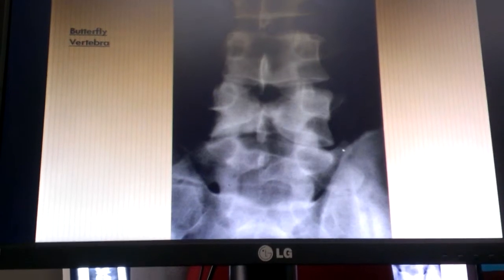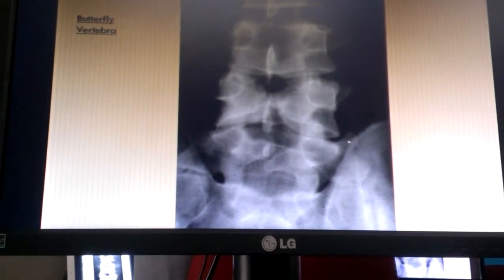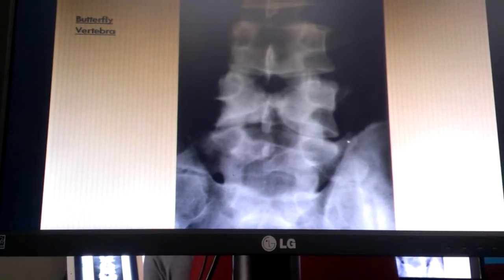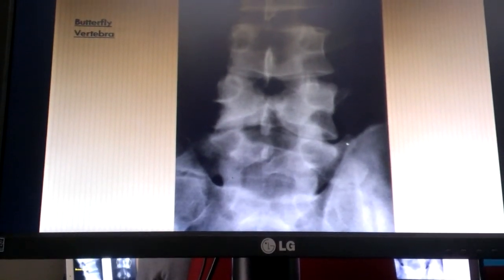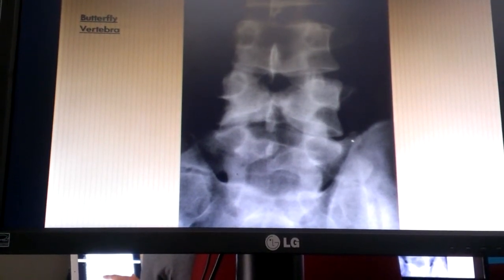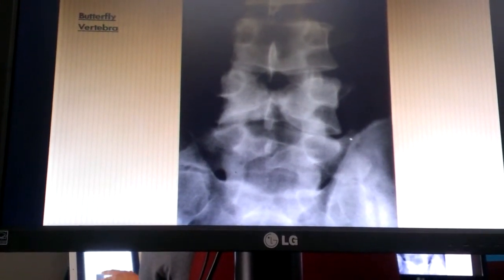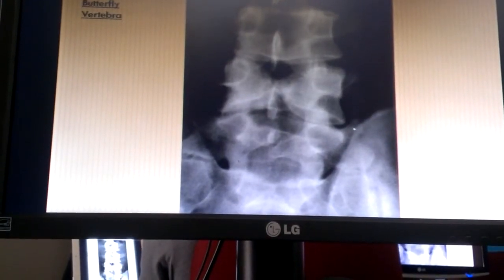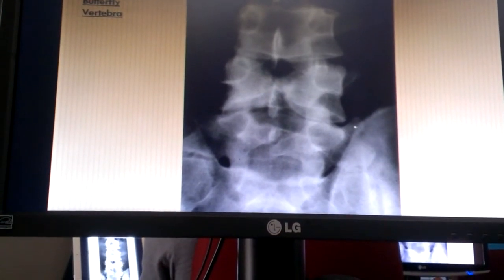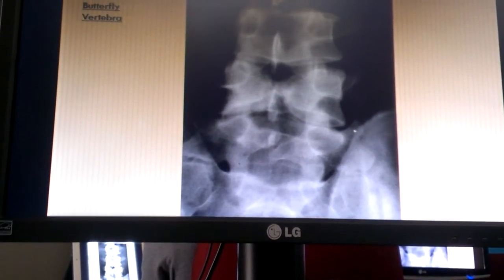So, but a hemivertebra isn't like that. A hemivertebra, a whole portion is missing, right? Here, it's like just a central core, and so if anything, it's a substitute scheme, right? So osteoid has been substituted for notochordal material, that's all. But with hemivertebra, a portion just didn't develop, right? There's a little bit of a difference there.